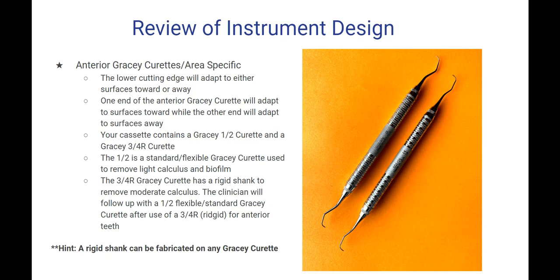Review of instrument design. The anterior Gracey curettes are area specific. The lower cutting edge will adapt to either surface, toward or away. One end of the anterior Gracey will adapt to surfaces toward, while the other end will adapt to surfaces away.